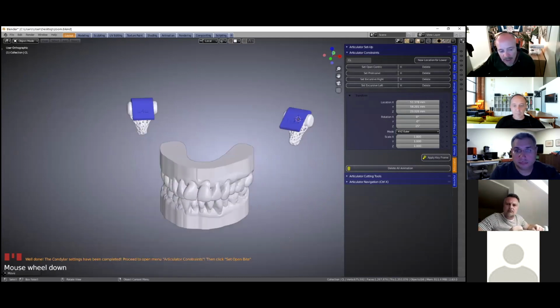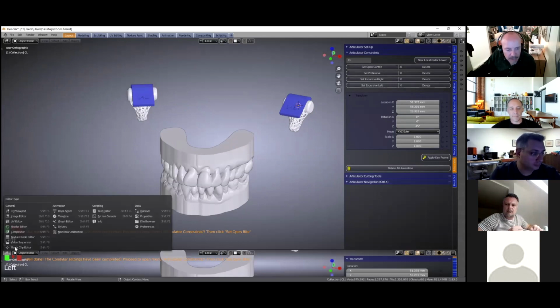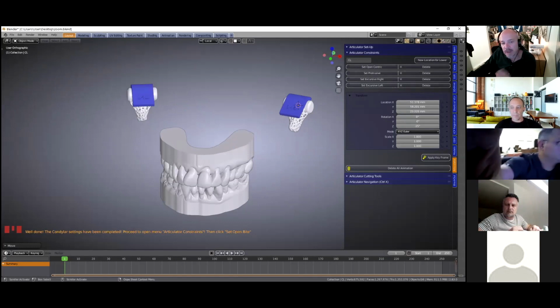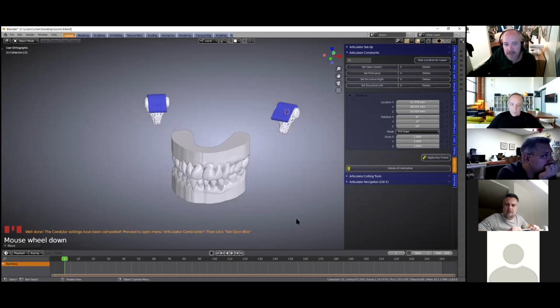And now with the articulator, it's a good idea to have a look at your timeline. Where's my timeline gone? All right, so this is the timeline. And first there's 0, 1 to 250 frames. But the script cuts it down to, I don't know, how many is it? 5 or something. 5, I think.